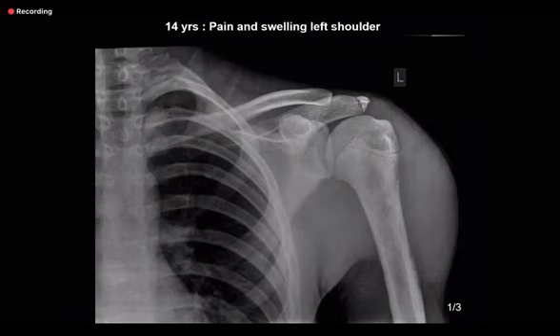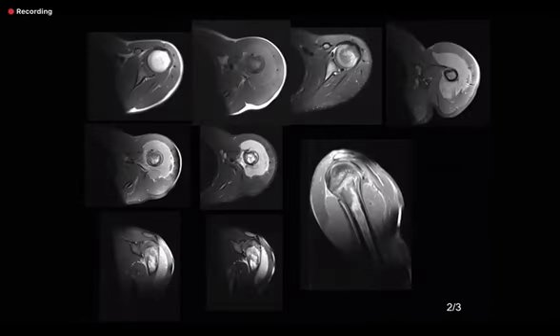Frontal radiograph of the left humerus. In the left humeral metaphysis, I can see a medullary-based ill-defined lesion with a wide zone of transition. This is associated with a large soft tissue component. There are also areas of what appears to be some periosteal reaction. It doesn't appear to involve the joint space. I'm concerned about an aggressive lesion in this patient. My top differential will be an Ewing sarcoma given the soft tissue component. Osteosarcoma will be less likely given the lack of new bone formation. I would recommend an MR evaluation.